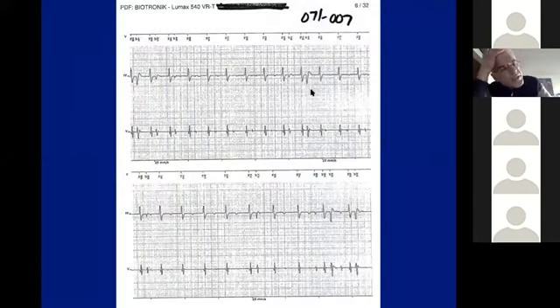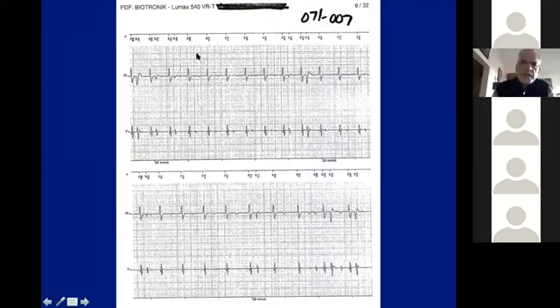Very important to look at the device markers, as I already mentioned earlier. This is a different manufacturer, Biotronik, not a very high quality electrogram. I apologize, it was sent to me from somewhere. But let's look at the markers. There are more markers. This is single channel.